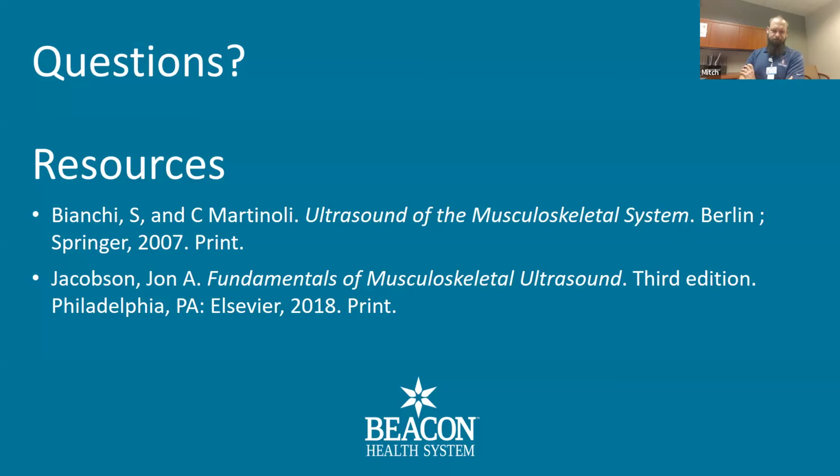Thank you. Yeah, just throwing out, because a lot of new people tend to watch these, in terms of annotation, typically what I teach is we should annotate to the level where someone familiar with ultrasound would recognize the images. And I could recognize all of those images. I think most people who do this recognize clearly the long and short axis of your images. But I also would throw out, just add in long and short axis. So, you had the side, the structure.